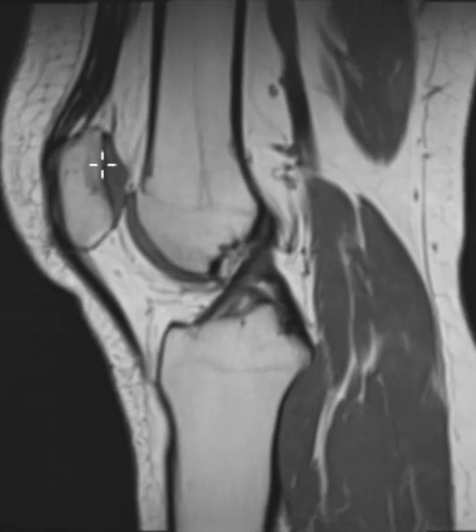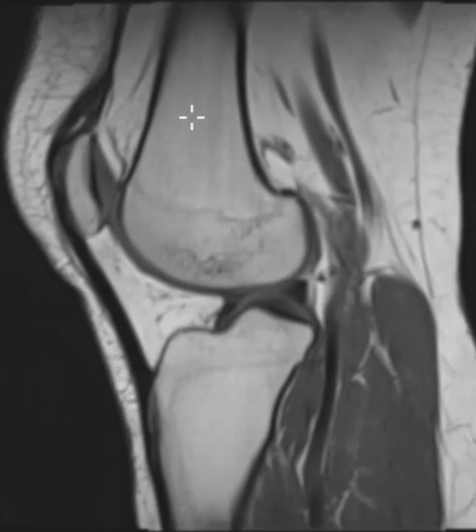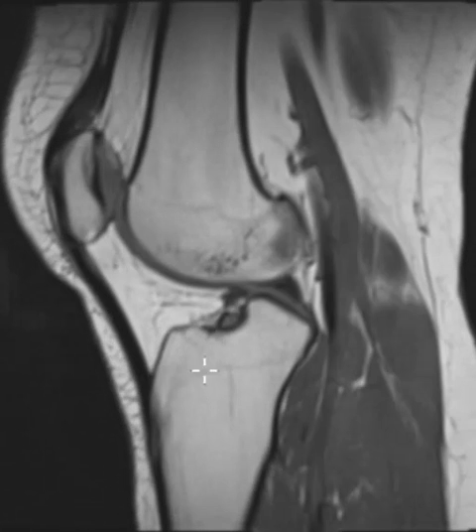And this is just a normal patient showing the three fat pads of the anterior knee. Over here on the left is the kneecap, the patella. The quadriceps tendon comes down here, attaches to the top of the kneecap. The patellar tendon comes down here along the bottom. You see the femur, this big thigh bone here, and you see the tibia down below. So these are all the boundaries.